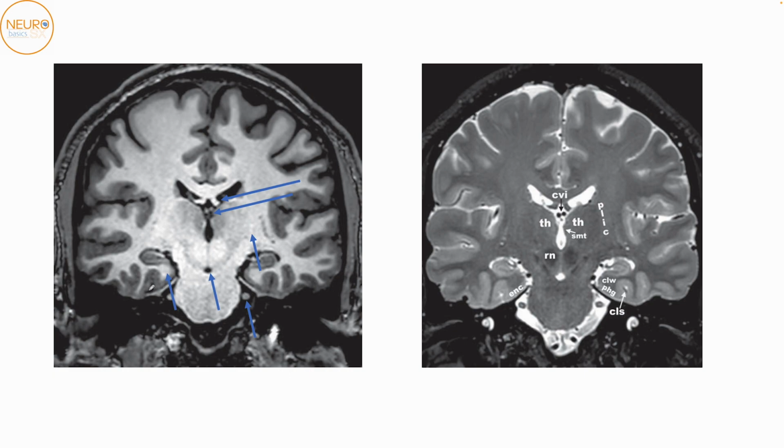Okay, so just the last few cuts left, and we'll wind up this session. So here is the parahippocampal gyrus, the hippocampus, the cerebral aqueduct. This is the optic tract over here. This is the fornix. These, if you can see, corresponding to the images on T2 are the internal cerebral veins. This is the interhemispheric fissure. This is the cingulate gyrus.